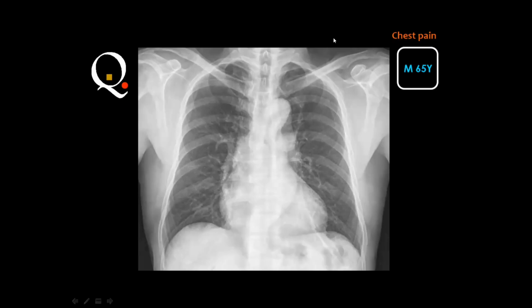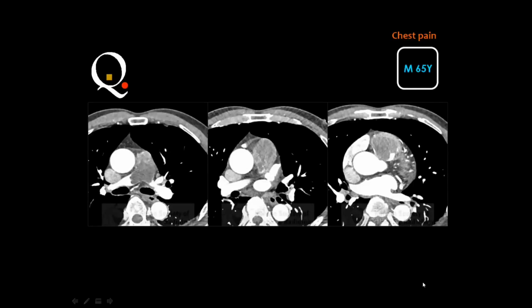and do not diagnose pneumomediastinum unless you see air in the neck. I said that very clearly. And all what you can see here is that the aorta is dilated and unfolded, the lungs are clear, and nothing else. But if you look at the CT scan of the patient and you see a big lesion in the pulmonary trunk, then what do you think?